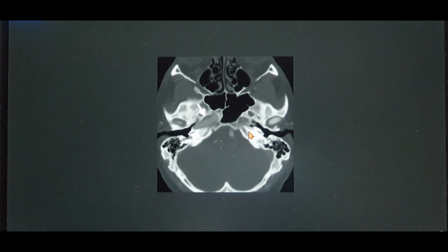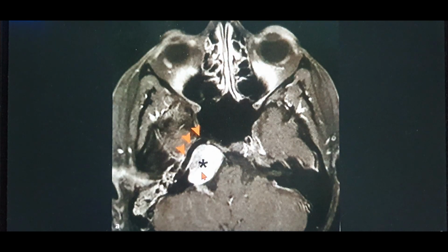Also, one point to note on the normal axial CT scan is that you can see the carotid canal, the part of the ICA within the petrous part of the temporal bone. That's the temporal bone right there. That's the mastoid air cells. That's the petrous apex region. You can see the carotid artery running in this carotid canal within the petrous part. If there's any lesion, as you can see over here, there is a lesion in the petrous apex. Actually, it is a cholesterol granuloma of the petrous apex. You can see how it is compressing the carotid artery. That's the petrous part of the internal carotid artery, which is almost at the level of the foramen lacerum.